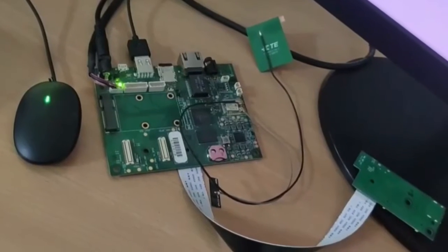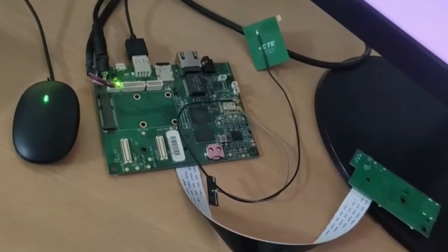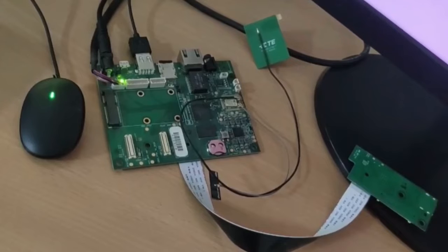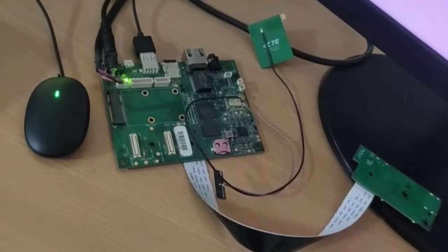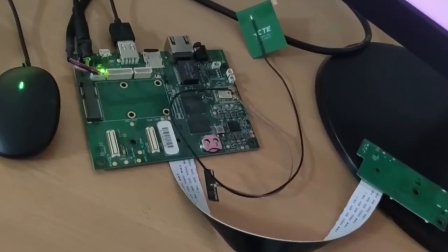This is the device which is used to monitor patient health, and this device is configured at the backend by admin to measure the patient health. A threshold value is set for each health concern, and if any of the threshold value increase or decrease for any cause, the respective doctor get notified or informed via email that the patient has been affected.